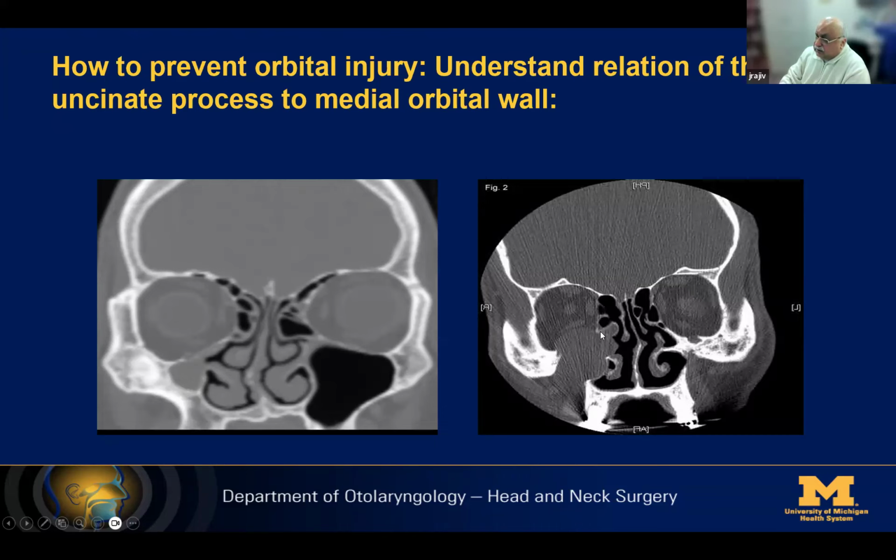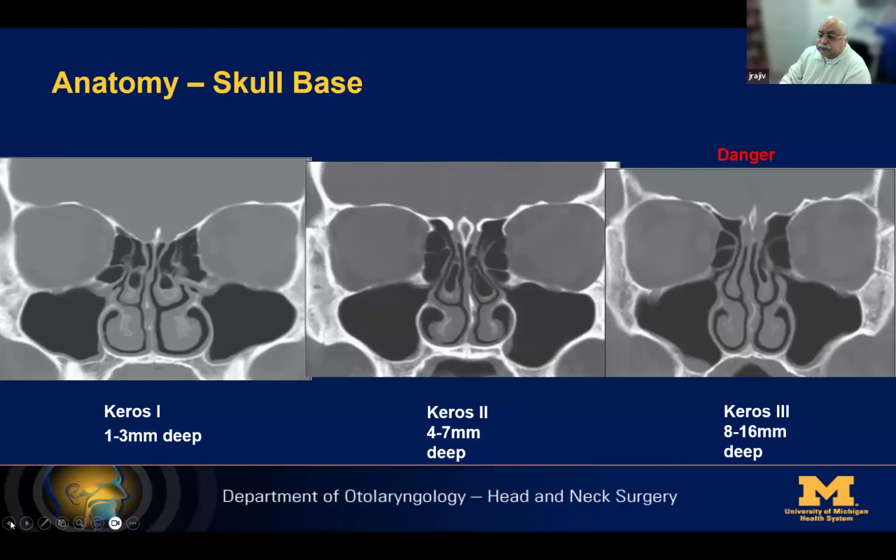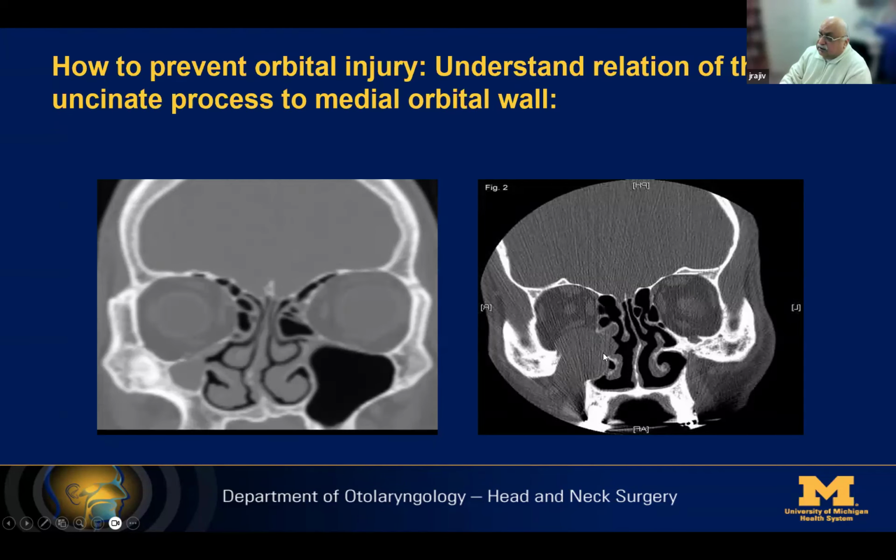Here you can see that there is narrowing and pneumatization of that uncinate process, which has resulted in formation of a mucocele, and there has been a prior attempt to drain this maxillary sinus via the Caldwell-Luc operation. That was unsuccessful because of the non-physiologic approach to the sinus, and this mucocele has developed because of that, with damming of secretions within the small volume of the maxillary sinus.